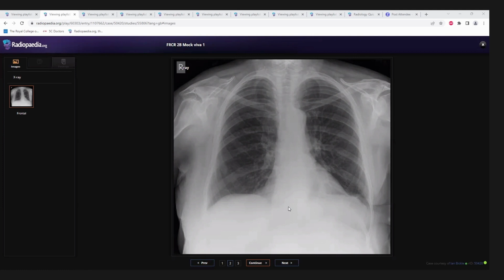Just for the sake of time, I want to show you many cases because you guys are exam going. So would you want to comment on the bones, please? This is a very common kind of exam case. Okay, regarding bones, both clavicles are okay. The scapula and head of the humerus: the right head of humerus is slightly irregular with relative sclerosis compared to the left side.